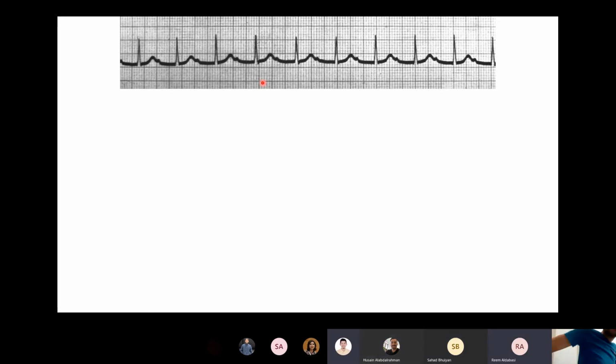Three degrees. Right. So let's say for this patient, I am not giving you the entire ECG, but imagine this P wave is a sinus P wave. So you always make sure it's a sinus P wave. If it's a sinus P wave and the PR interval is long, then you think AV block. So in this case, what type of AV block do you think it is? First degree. Good. Which is persistent PR prolongation, right? You have to make sure that the PR is fixed and steady in interval. So that's first degree.